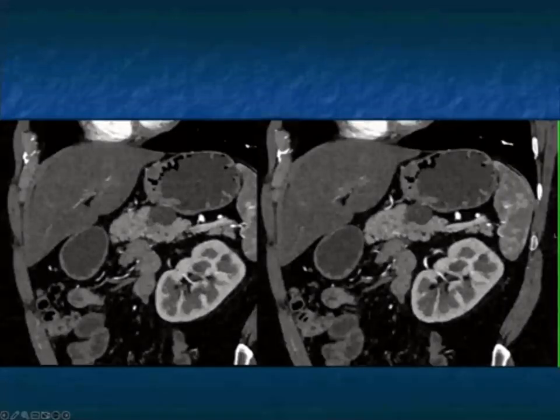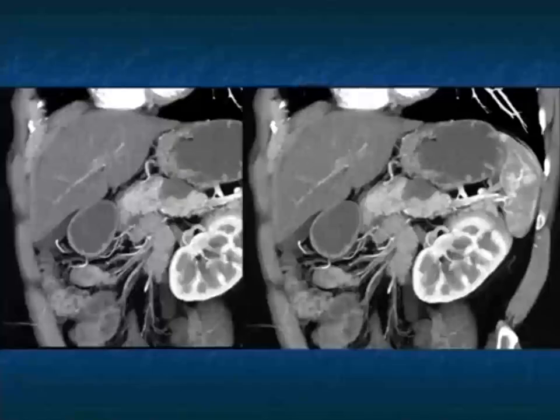The pancreas, kind of body of pancreas. Could this be an IPMN? I don't see a dilated duct, or I don't see any duct, rather. Could it be an MCN? MCNs usually have some septations, not always. Could it be a serous adenoma? Oligocystic serous adenomas have no septations. But I'm telling you, I'm still saying, to me, this is a lymphoepithelial cyst.